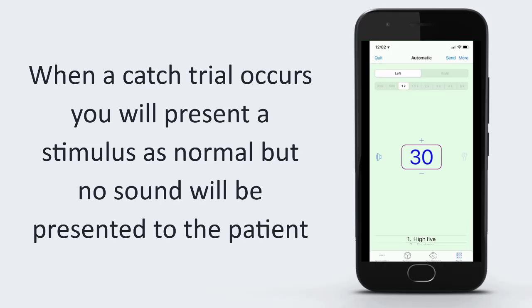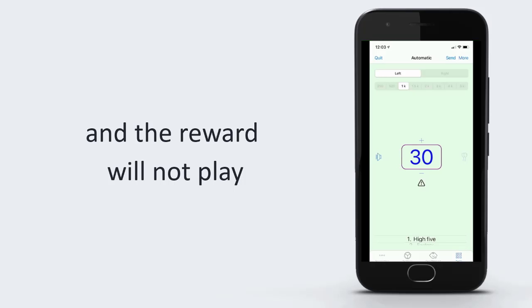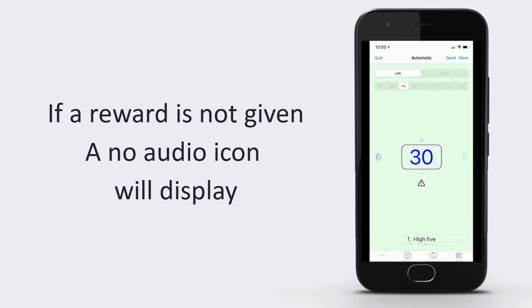When a catch trial occurs, you will present a stimulus as normal, but no sound will be presented to the patient. If a reward is given to the patient, there will be a warning sign that displays under the presentation level, and the reward will not play. If a reward is not given, a no audio icon will display.